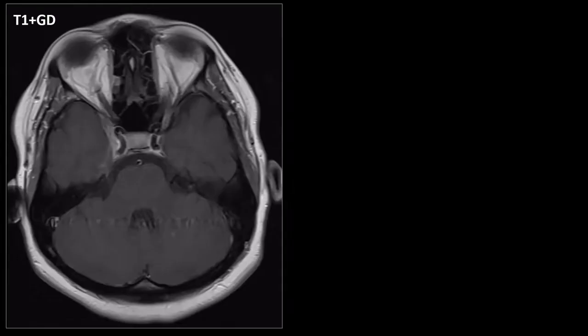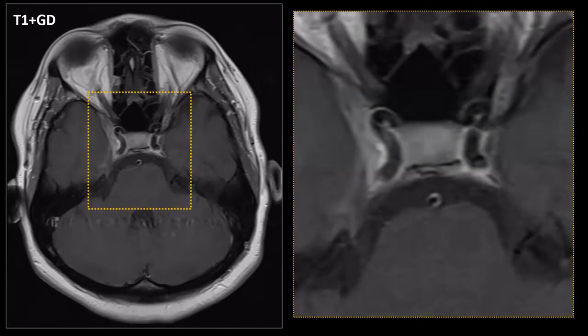This is a patient with a painful ophthalmoplegia, and on the T1-weighted images with gadolinium, if we magnify these a bit, we see a plate-like contrast-enhancing lesion involving the right cavernous sinus. So this is the cavernous segment of the internal carotid artery over here. So you could say, well, the cavernous sinus is composed of dura mater, and within these dural layers we have these channels filled with venous blood rather. Okay, but the meningioma of the cavernous sinus will generally not manifest with a painful ophthalmoplegia.